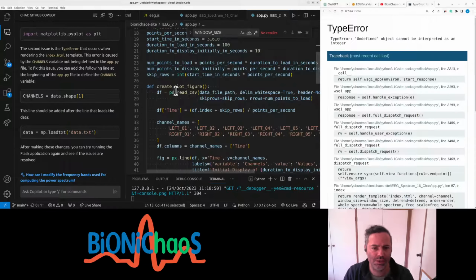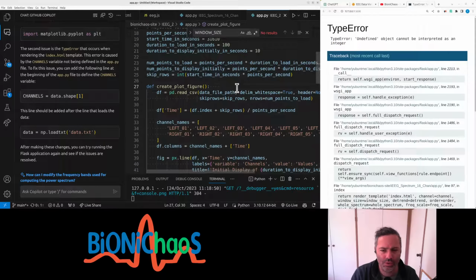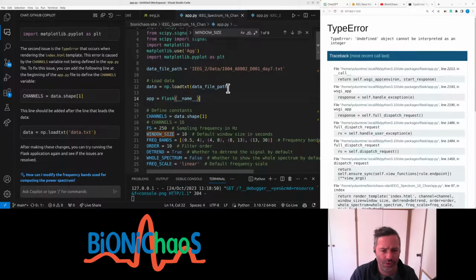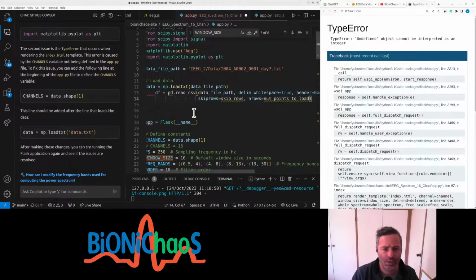We want to just read one channel. Should we just read the one channel to begin with? Oops, what did I do? Guess we need this line for sure, instead of just loading the whole file.